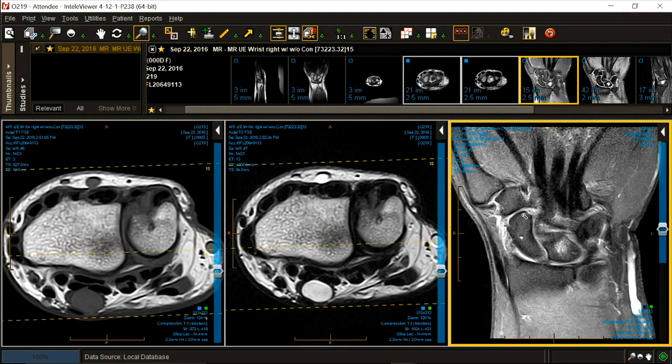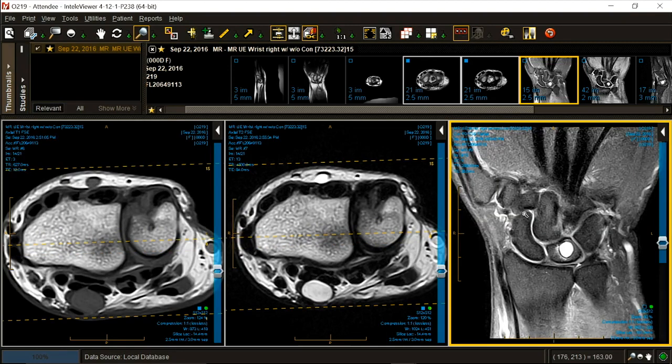Within the lunate is a large, round, cystic lesion. Statistically, what's most likely? Intraosseous ganglion. Often asymptomatic, often friction-induced. The patient also has a central 1/3 TFC perforation, fenestration, or tear. Probably not symptomatic, not very swollen.